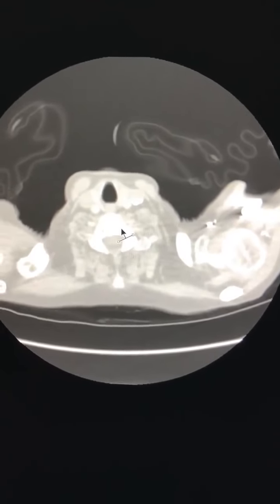Next thing is just change it to the soft tissue window again, and we have to see the lower neck. The thyroid looks fine, there is no lymphadenopathy. Going down to the mediastinum, I do not see any size specific lymphadenopathy. There is one lymph node over here, but if you measure the short axis, it is just about 8 mm. So this is again not size specific lymphadenopathy. Okay, going down, there is no pericardial effusion.